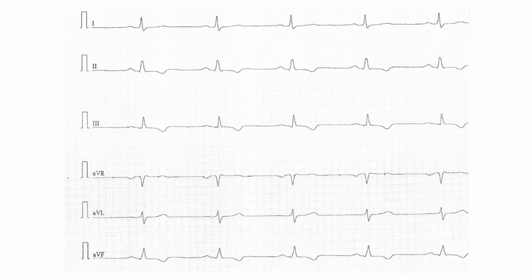The patient underwent EP study where the diagnosis was confirmed. This is his resting ECG after ablation. The initial Q wave in lead 3, representing the initial activation via the atrioventricular bypass tract, is eliminated after RF ablation. In summary, we have to always think of a Mahaim accessory pathway in patients with wide complex tachycardia with left bundle branch block pattern with a left superior axis, a late RS transition, and a structurally normal heart.